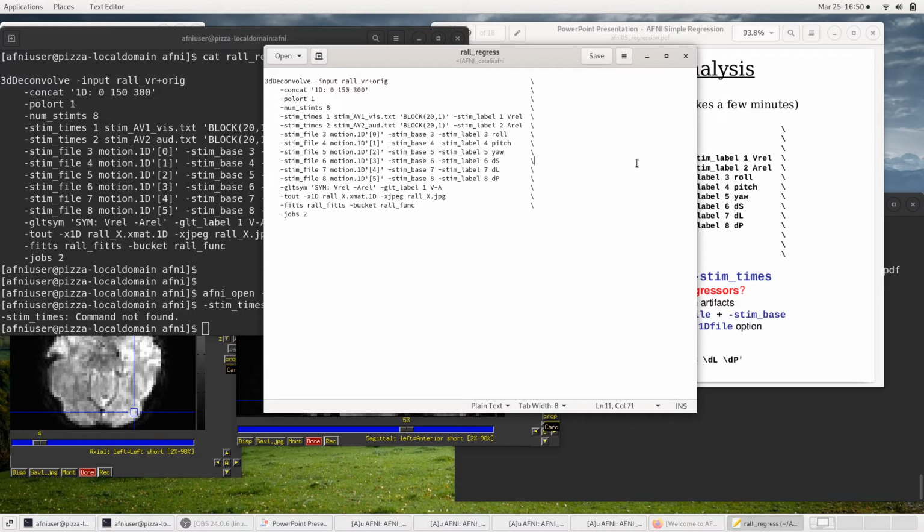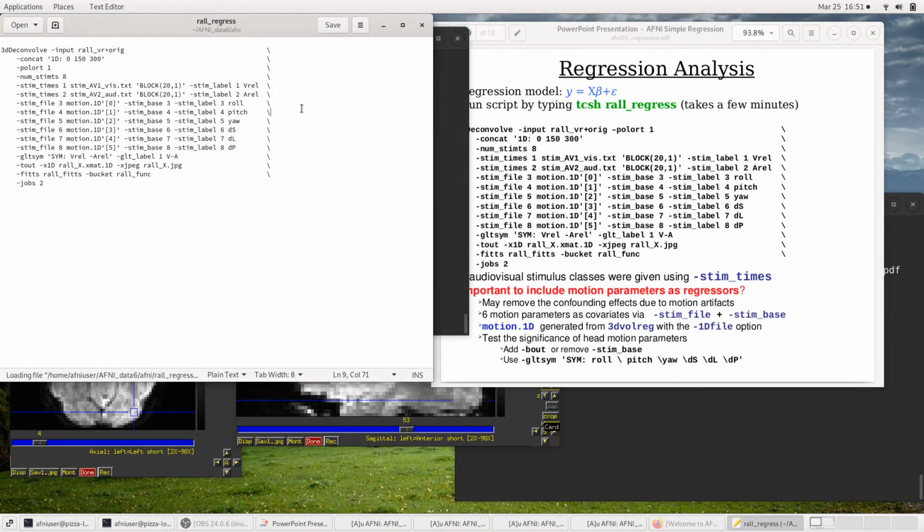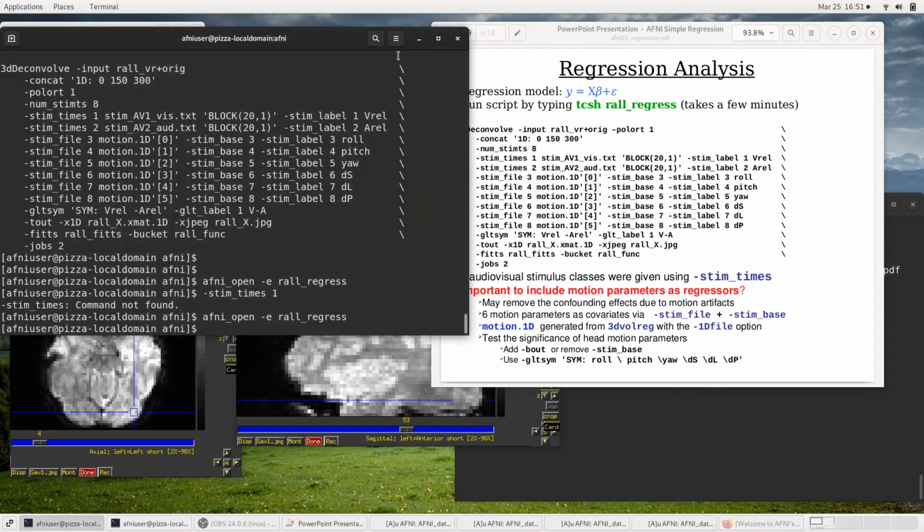As long as I'm babbling about that, I'll go on a side view and note that if you want to find out where they might be, let me open it up again and add a couple here. So now this has spaces here, and I'll save it. If I want to check this now, I can run file_tool -test -infile rall_regress.